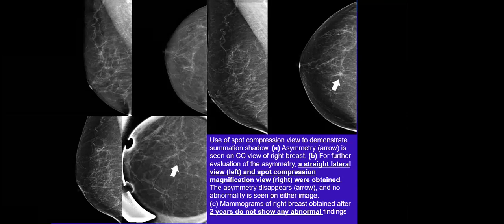Technique? It is not technique. It is not the posterior part. You are right, you start correctly. Excellent. The lesion is posterior, close to the chest wall, seen in one view, one projection.